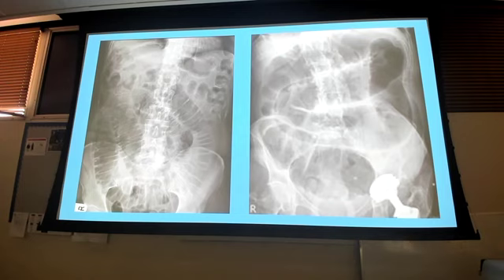So if you get a picture that shows large bowel clearly, and you're like, gosh, is there small bowel involved? I can't really tell. Don't spend your time diving deep and trying to figure it out because it doesn't matter. Because the problem is always in the distalmost location. So if it's like this, then it's a large bowel problem.